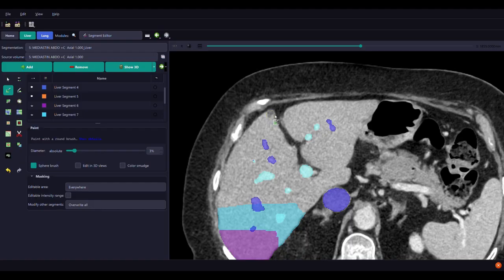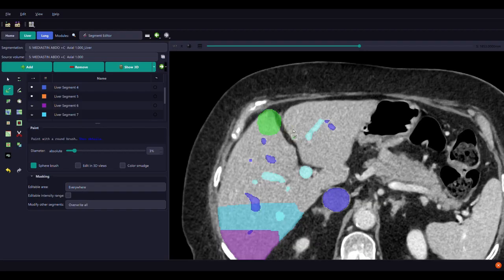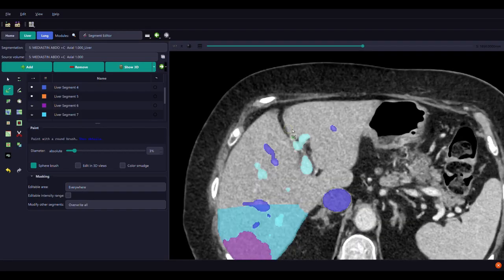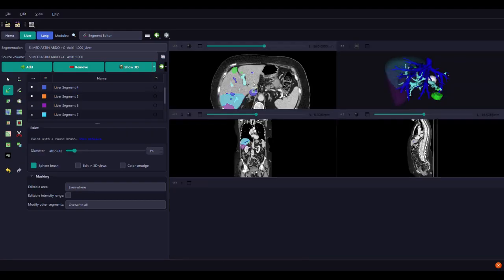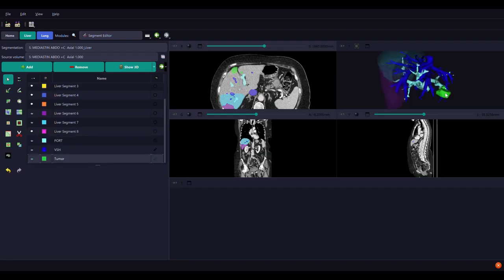And then let's say you want to draw, I'm going to make the line thicker so you can see clearly what it looks like on the 3D model. There. So here, I think this is a tumor. I add it to my 3D model by simply clicking on the left mouse button, and presto, it added what I thought was a tumor directly onto the 3D model.